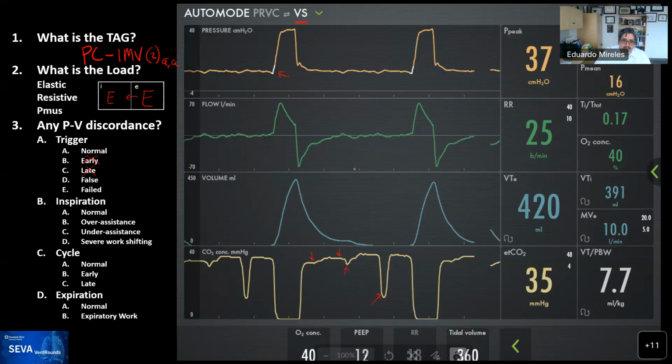as the patient failing to trigger the breath. Actually, you can see in correlation with this dip, there is this hike on the volume, and a rise on the flow, and there is this drop in pressure. So this would be consistent with a failed trigger, as Victor is saying. And here I don't see much change, but I do see those aberrancies on the flow and the pressure waveform.